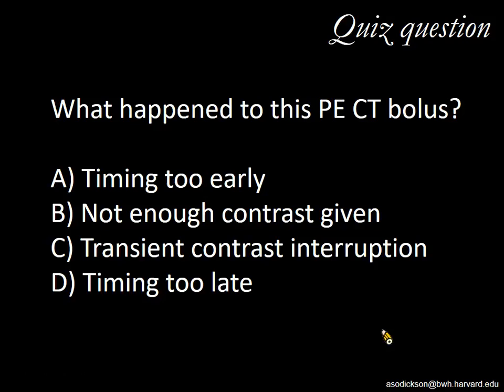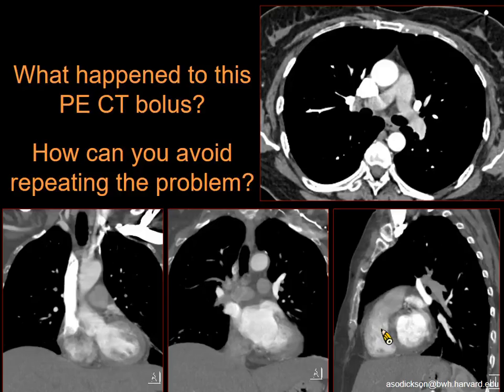These are the options. A, the timing is too early. B, we didn't give enough contrast. C, transient contrast interruption. And D, our timing was simply too late. I'll go back to the image here so you can make your decision.